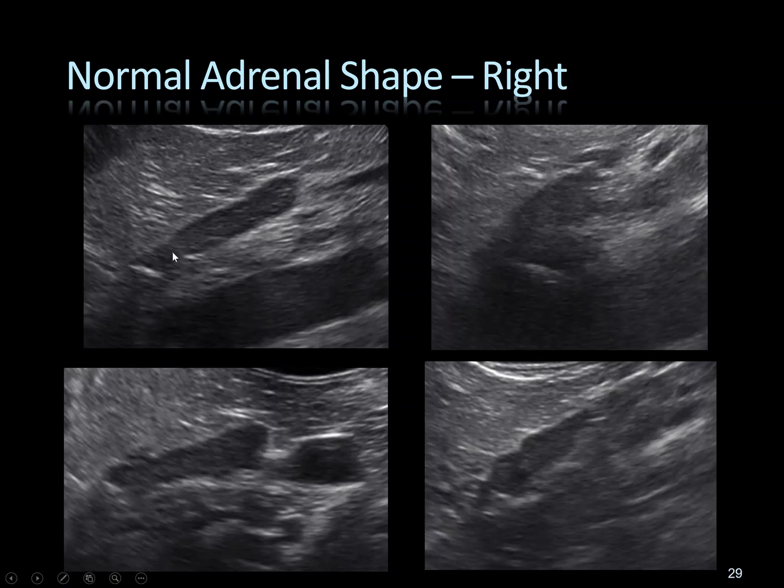Again, like I said before, the ones that are long, usually there's a portion of the cranial pole that's coming out of the plane in the other dimension, so we don't really appreciate it. And so if you could get the perfect image, most of these would look kind of arrowhead shaped, but again, we usually just have a hard time catching that full appearance on ultrasound.